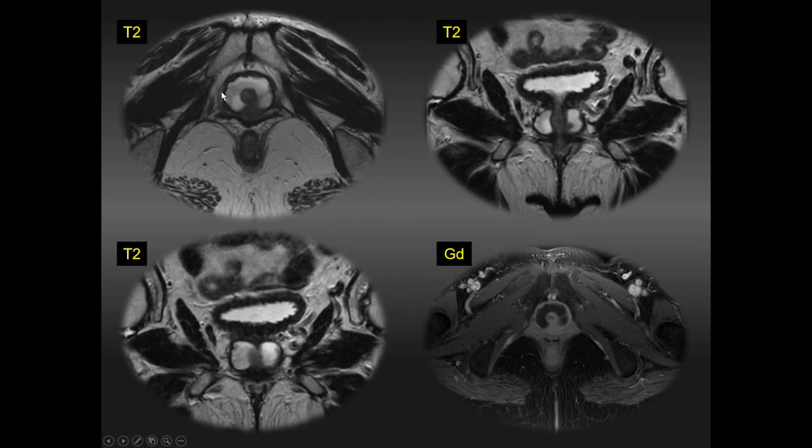As you can see on the axial image, you have this curvy linear horseshoe-shaped T2 bright diverticulum surrounding the urethra, which is in the center right here. On coronal, it looks like prostatic tissue, but it's very bright on T2. You can see here is the urethra, and it surrounds the urethra bilaterally. Again, seen in a somewhat anterior location on the coronal T2, and then on the axial gadolinium enhanced image, you can see that the area of the diverticulum is relatively devoid of enhancement, with a little bit of enhancement along the wall owing to inflammation, and this is the enhancing urethra in the center.